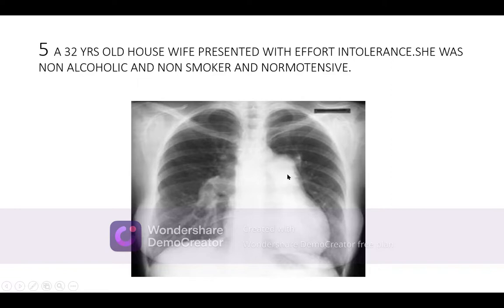Pulmonary hypertension, evidence is also here. You see the hila are enlarged and prominent, and thick bronchovascular markings are spreading out from it, a sprouting effect. Although the lines are coming out of the hila, they are thinning out. Look at this. This is called the pruning effect, P-R-U-N-I-N-G. This is a very important part of pulmonary arterial hypertension. It is not seen in venous pulmonary hypertension.